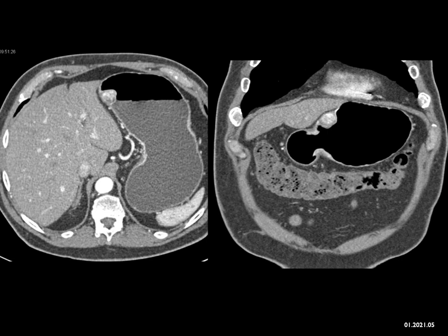I don't see anything in the liver. I don't see anything in the spleen. And I'm thinking it's hypervascular. So what things could I think about? GIST tumors can be vascular, but they're usually not so vascular, and it's kind of small for a GIST that would be symptomatic. Lymphoma is typically hypovascular.